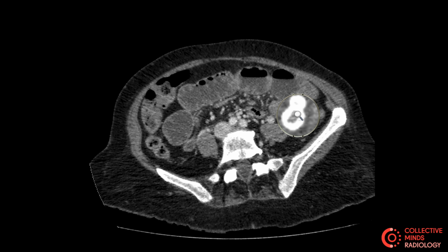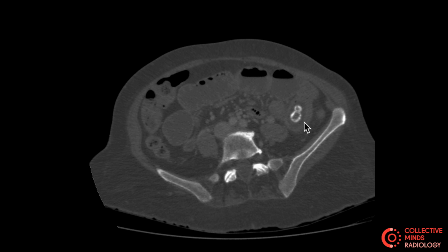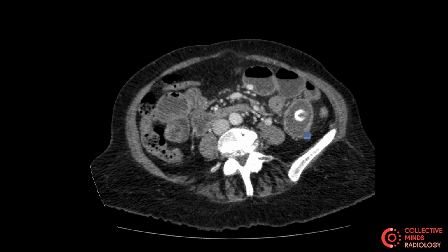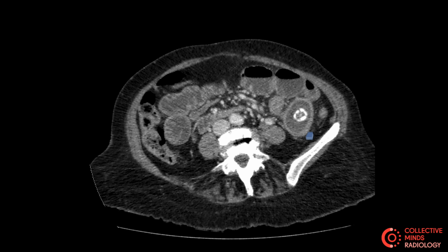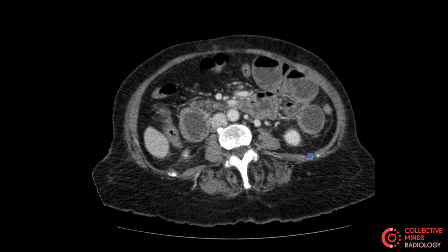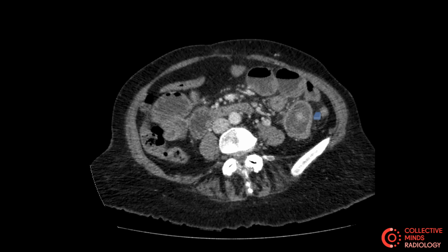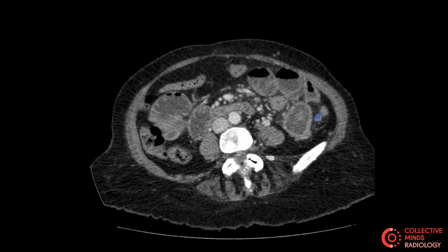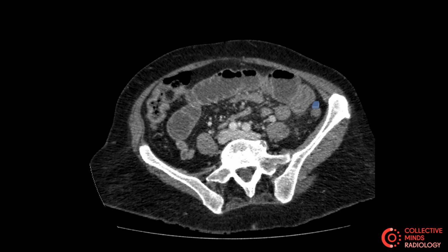As you scroll through the small bowel, you hopefully would have noticed that there are these dense structures sitting within the left lower abdomen over here. Now if I go to the bone windows, you can see they're very spherical, they look lamellated, they've got sort of a dense outer calcification. There's multiple of these sitting within the bowel wall over here, and actually everything sort of proximal to that area looks very, very dilated, like dilated bowel. So this is definitely small bowel because it kind of communicates with more small bowel as you go up.